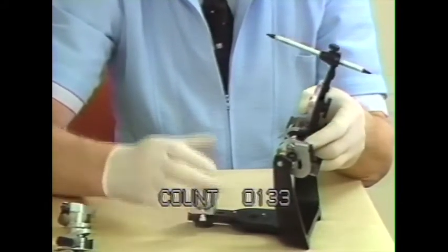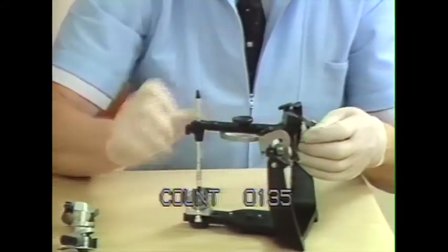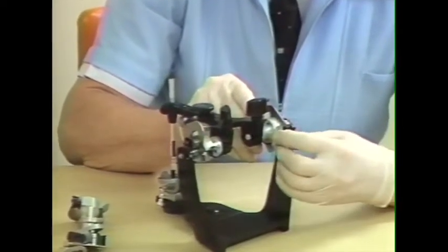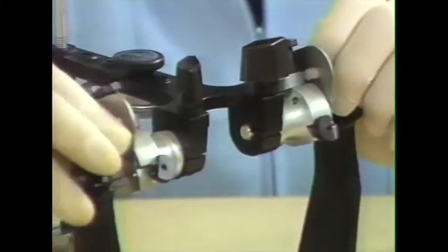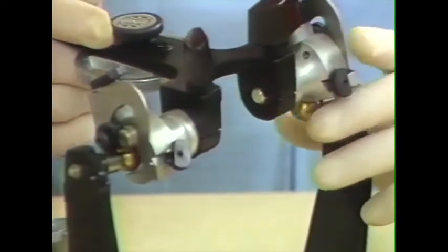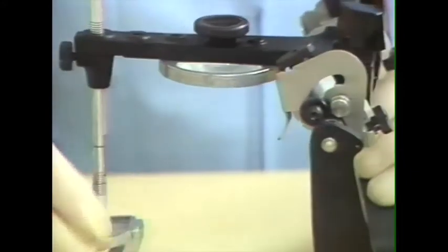Secondly, the members of this articulator will separate. To separate these, there are these screws, these little cams in the back, and we can unlock the articulator and the members will come apart, which is a nice feature for restorative dentistry. Fixed restorative, like this feature very much.